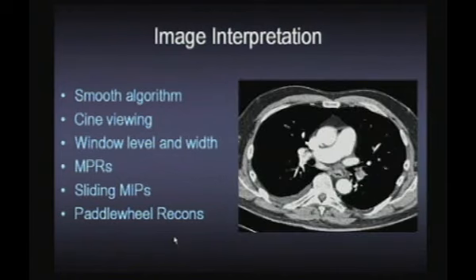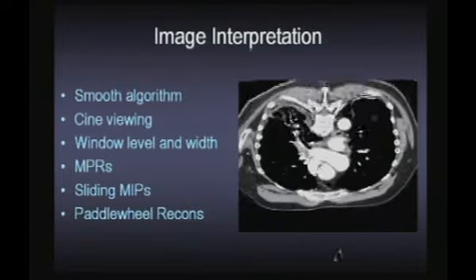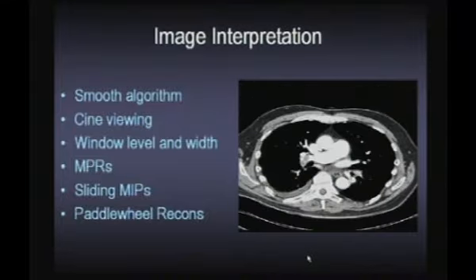Some authors have also suggested going a step further and doing rotating multiplanar reconstructions to elongate out vessels, but really I think apart from a bit of vertigo, this doesn't really help in the interpretation. You know, I did this slide last year and it took me a whole day to do, and all the PEs are visible on the very first slide.